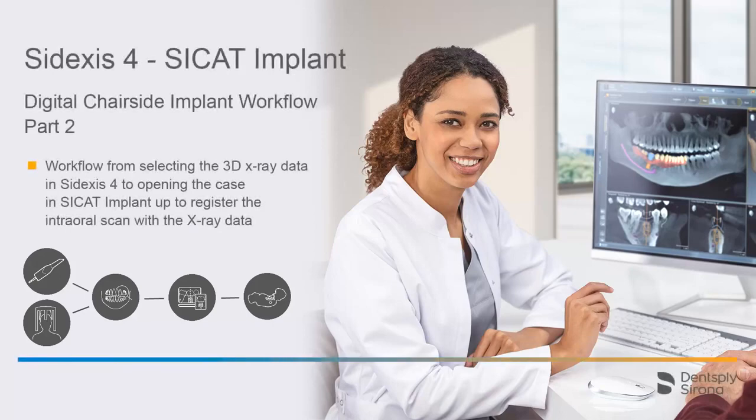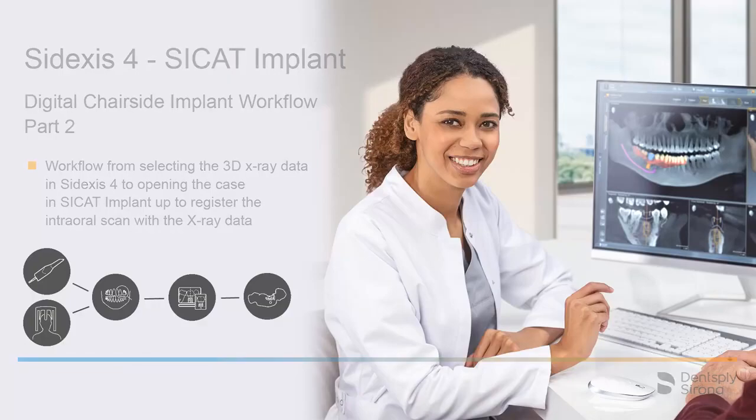Welcome to this video tutorial on the topic of digital chairside implant workflow. This video is part 2 of a tutorial series. In this video, we focus on the workflow from selecting the 3D X-ray data in Sidexis 4 to opening the case in SICAT Implant up to registering the intraoral scan with the X-ray data.